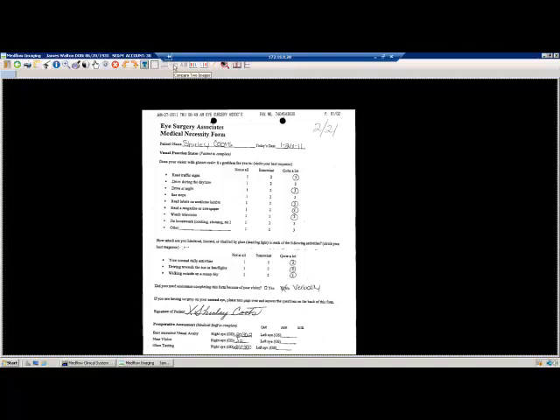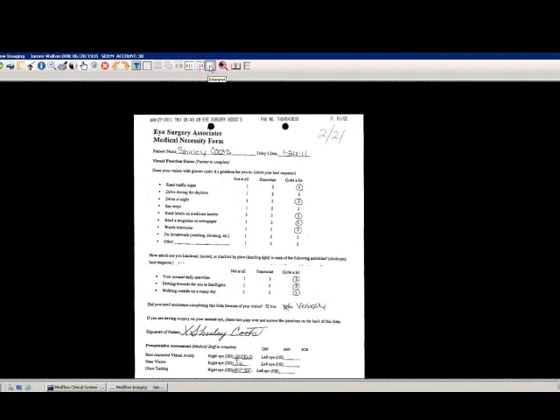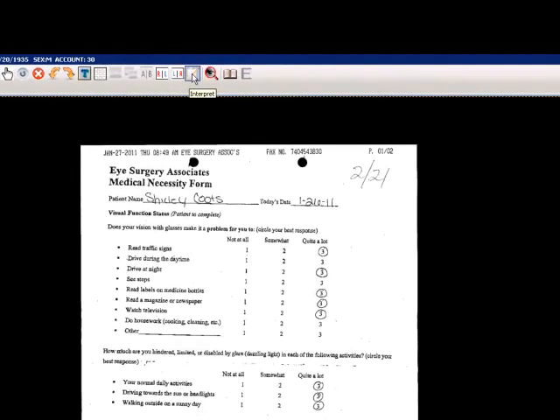And if you wish to compare two images side by side, you would use the two pictures located side by side. If you wish to change the order from right to left or left to right eye, you can select which way you view the image. You'll also notice at the top of the screen the tablet with a pencil. This will allow you to do an interpretation on the image.